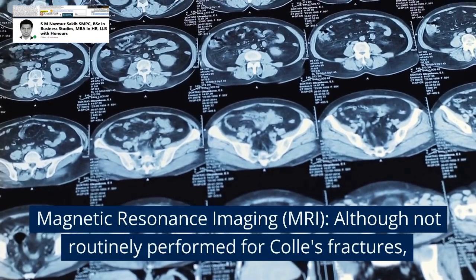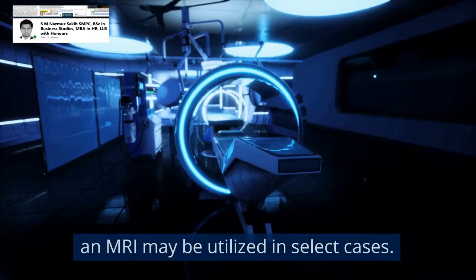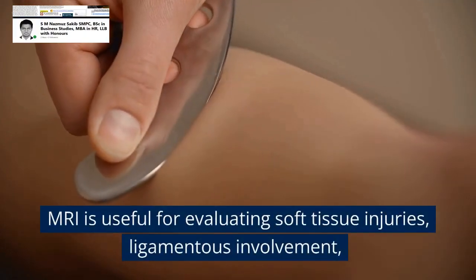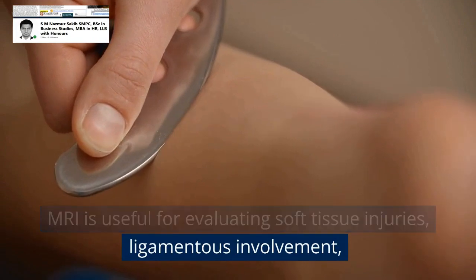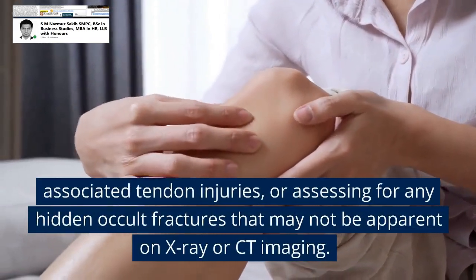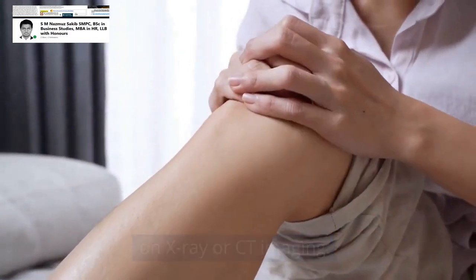4. Magnetic resonance imaging (MRI). Although not routinely performed for Colle's fractures, an MRI may be utilized in select cases. MRI is useful for evaluating soft tissue injuries, ligamentous involvement, associated tendon injuries, or assessing for any hidden occult fractures that may not be apparent on X-ray or CT imaging.